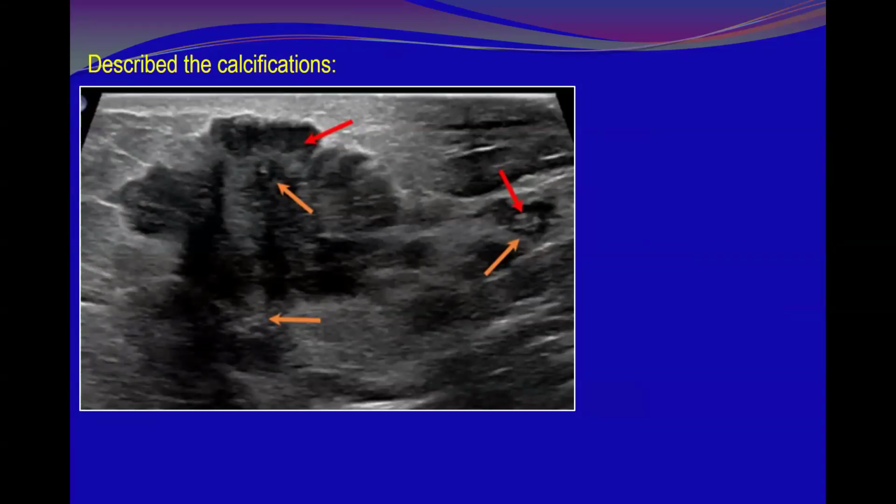Describe the calcification in this case, please. What are the ACR descriptors of this calcification? Microcalcification in the large one, and also microcalcification in a smaller lesion. Okay, it is a microcalcification, but we have 3 main descriptors. What are these 3 descriptors? Even if you did not say micro. Mass. Yes, this calcification.